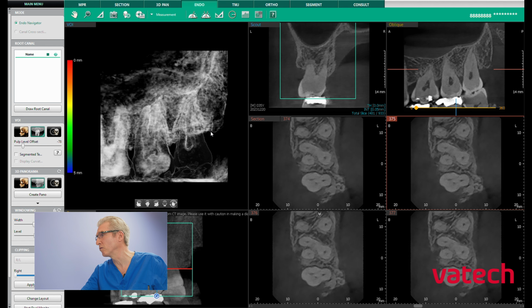If we're taking a 4x4 scan, we can now use an endodontic scan, and on this site we can actually plot the courses of nerve canals within that. So our endodontist has spent a lot more time messing around with that. And certainly on this scan, we can see quite clearly, even on the aged teeth in my head, we can see all the nerve canals really quite easily on there.